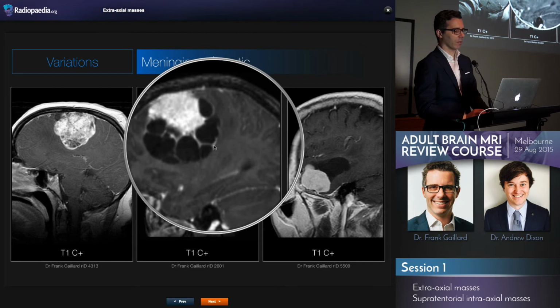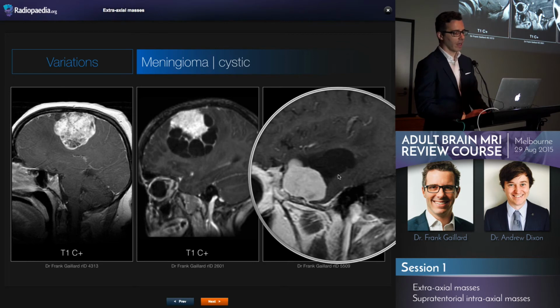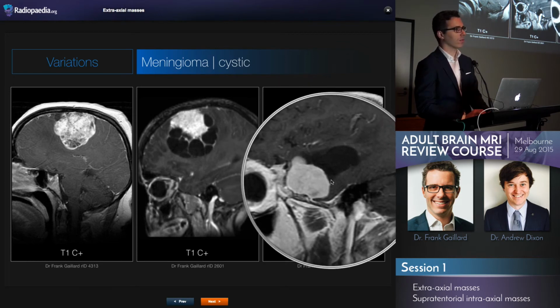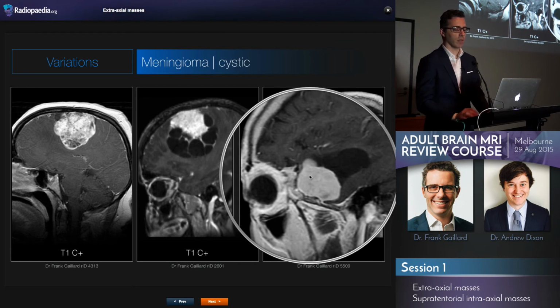come out if possible. Whereas in the third type, where you have a peritumoral cyst, you're just having an arachnoid cyst or a pocket of CSF that keeps accumulating and pushes the brain away, but is not related to the tumour itself, and nothing needs to be done about this wall. You can just carve away the meningioma itself.